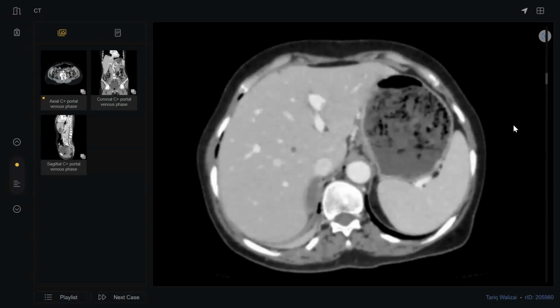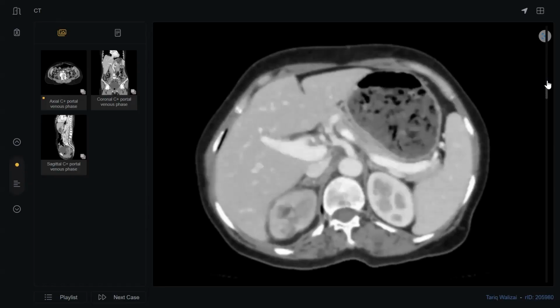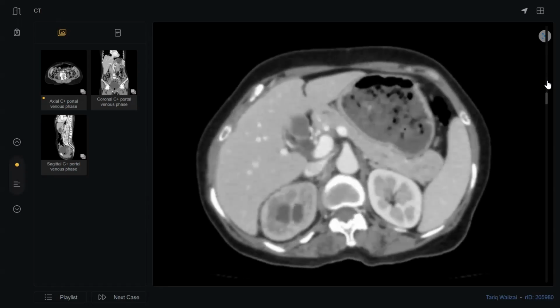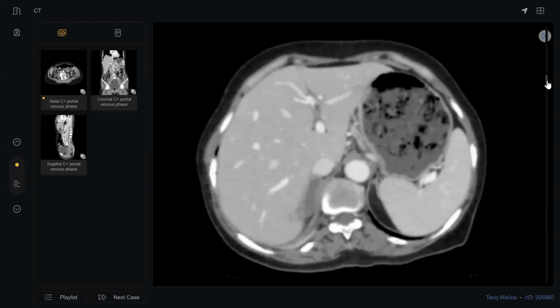Leave the mouse, use the arrow. Use the arrows. Okay, slowly moving now. I'm going back again. Liver, I'm looking at the. There is lag.